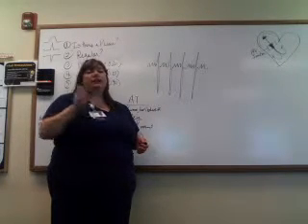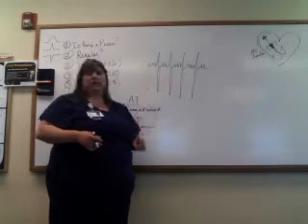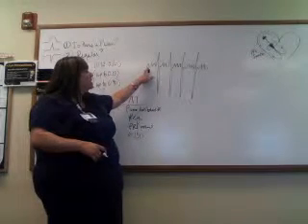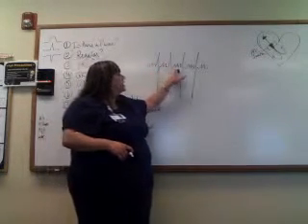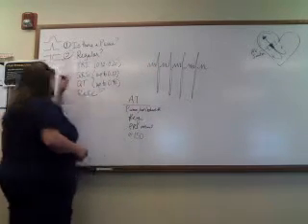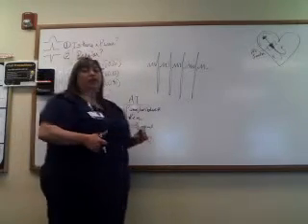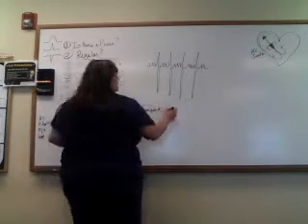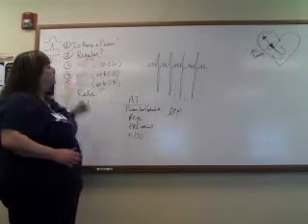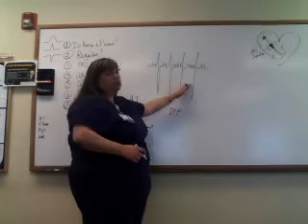So remember, the heart is just a muscle, and it pumps on its own. We're not telling it every time to pump. So sometimes it can malfunction. And so he's the little guy sitting there ready to act if he needs to. So what happens is these little pointy waves here, we have more than one for each QRS. So right away, we would know that, hey, there's not one P wave for every QRS, so it's no P wave, okay?